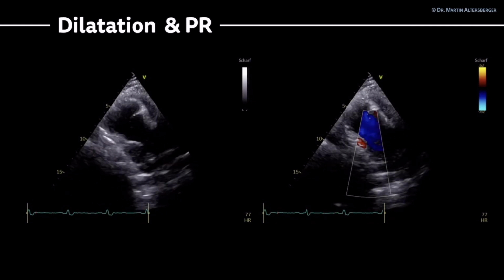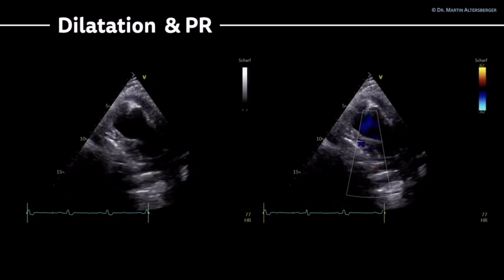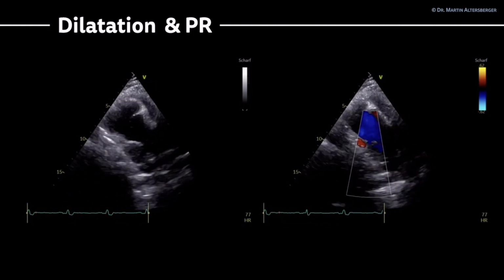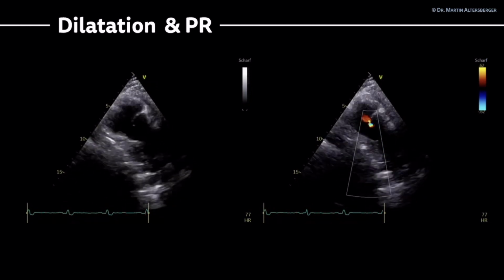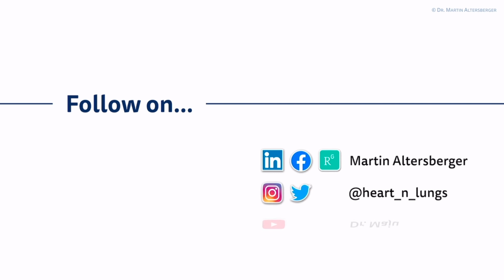Now with these specific views, the atypical views, which at least you should try to learn and then use in the situations you need them, we will conclude the sessions of the parasternal long axis view. I hope you enjoyed it. I hope I didn't miss some views, but with what we have learned and visualized on the specific EchoPAC software and with these cases, I think you got quite a broad overview over the topic of the normal and pathological findings of a parasternal long axis view.